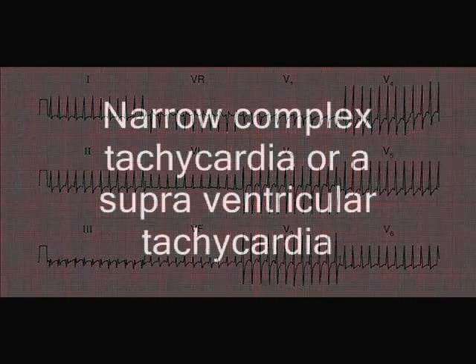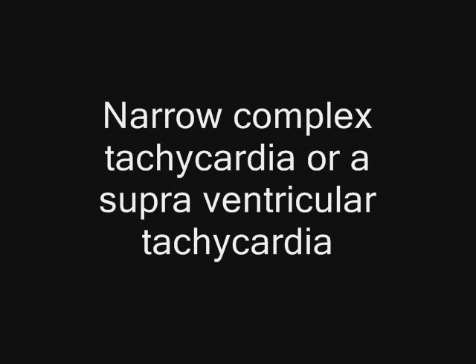It is a narrow complex tachycardia. We cannot be certain it is sinus rhythm.